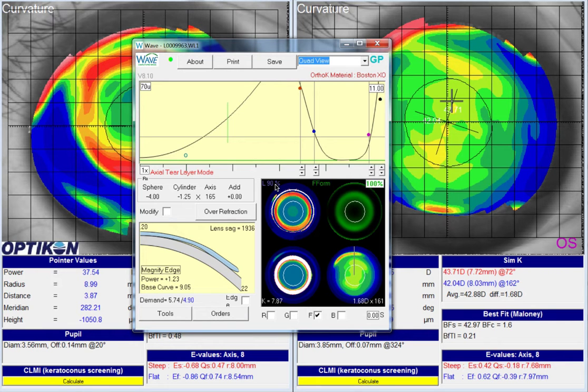And here's the lens that the patient is wearing for the left eye right now. This one's in freeform. It looks like you were doing a little GSIM versus freeform experiment, which I love to do with my patients. And I think it's possible that this steep area here that we see on the topography is causing wave to create a lens that is a little bit too tight or has a little bit too much sag superiorly, and that could be causing some of our problem.